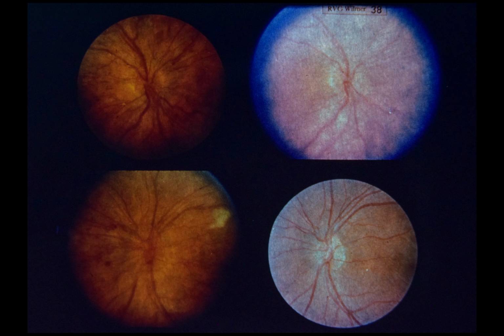In fact, the left eye had more extensive disc neovascularization than the right eye initially. 1 year after the initial examination, disc neovascularization in the untreated left eye disappeared completely. The lower right photograph was taken 5 years after the lower left photograph and shows that disc neovascularization has not returned during a 5-year follow-up.